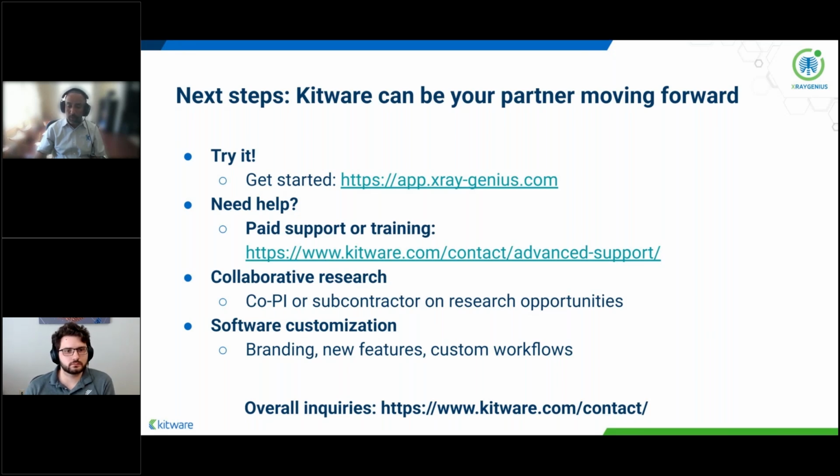Volview is our web-based visualization application that is built using VTK.js, the visualization toolkit, JavaScript library, and Volview is customizable. So, for example, in some cases, you might not be interested in some of the 3D volume rendering visualization aspect of the app. And that's something we can help customize as well.